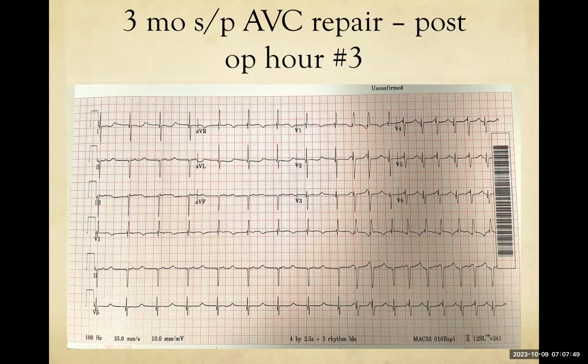And, without meaning too much disrespect or poking too much at our anesthesia colleagues, that's what they would usually do in the operating room. But in truth, you could just pace the atrium, right? And see if you conduct, because now we're saying this is probably VT because the QRS is wider than these beats. If you were to pace the atrium at a rate faster than this rhythm, let's say just for the sake of conversation, that this R to R interval is roughly 150 beats per minute. So you decide you're going to pace at 160. If you paced and you were conducting 1-to-1, would the QRS look like this, or would it look like this?